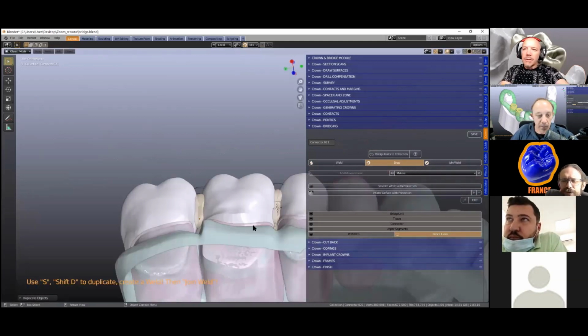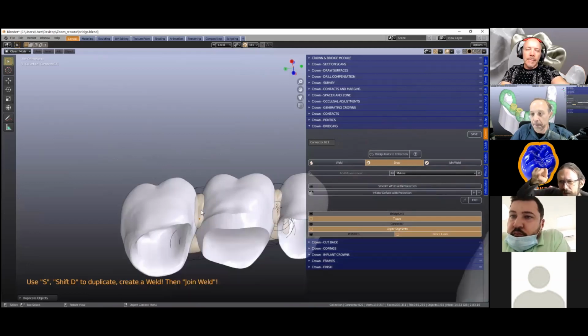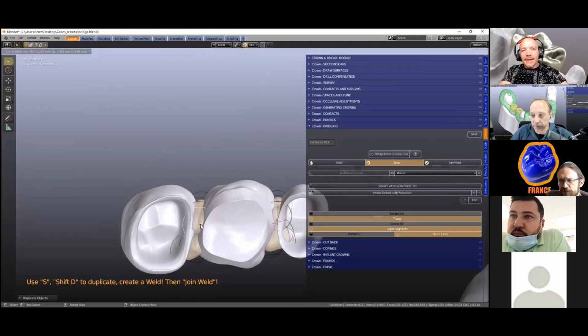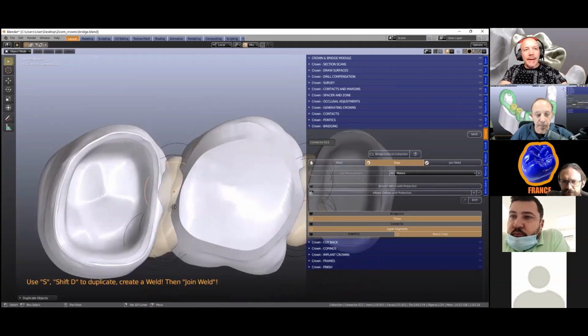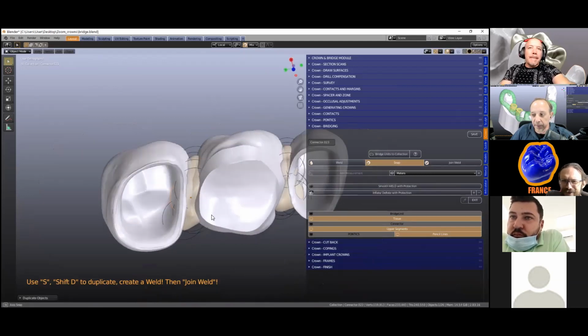I think we should have a shape to adapt for the micro brushing, so the patients, we are sure, can micro brush there. So we can put a conical shape in between the interproximal area, so we are sure they could brush there. I love the way you think. I think this is such a good idea. Yeah, it really is. I patented it just now.